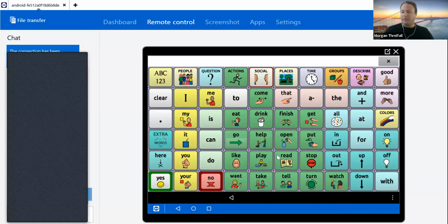I just wanted to chat a little bit now around the layout of WordPower. So it was designed at the very start with an adult AAC user in mind. So that was the first person that they designed it for. That person had a little bit of literacy skills. They understood pictures. The person understood categories of words.